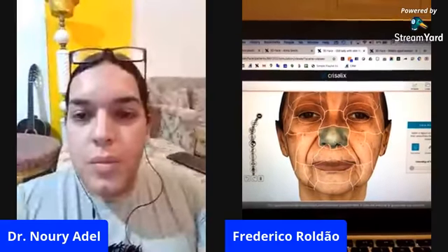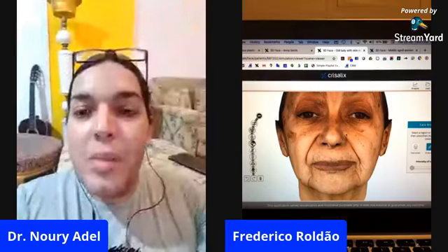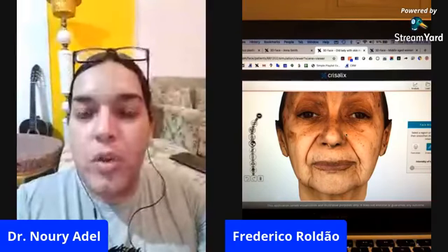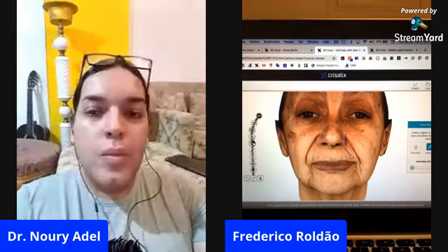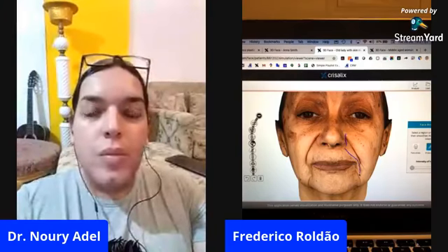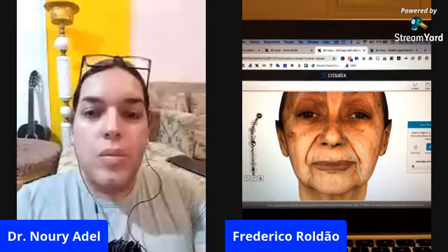A very easy way to do that is to draw the area. There are some areas of hyperpigmentation. Can you lighten those areas? We can work on that as well, yes. Let me just try to take these wrinkles away and the nasolabial fold here to make it look a bit younger.